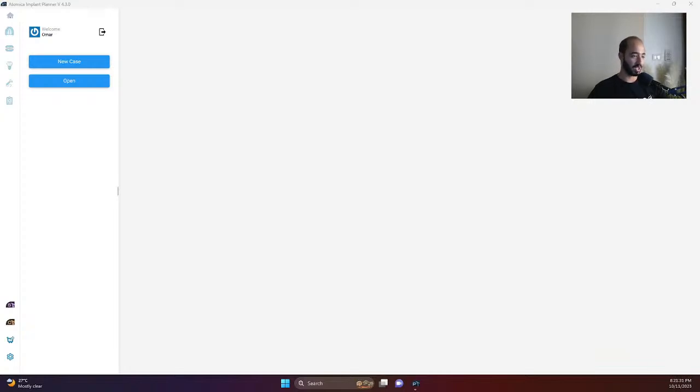I am Dr. Omar Yasser, the product specialist here at Atomica AI, and today we're back with another simple case, demonstrating the utilization of Atomica software suite in planning and designing surgical guides. So let's get started. Okay, let's take a simple case together.